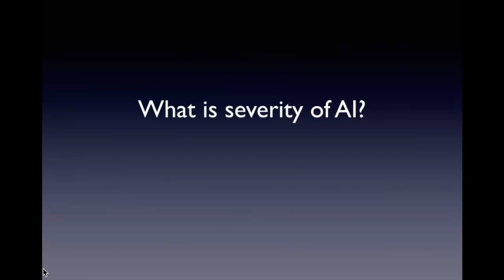Yeah, so I probably would have called it moderate to severe. I think moderate is like the starting point, so I wouldn't call it anything less than moderate. So my standard would be moderate to severe. Then think about a TEE to further quantify, and CMR is a useful technique as well.